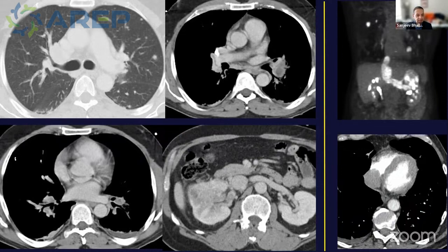Do you see mosaic attenuation? Atypical for acute PE. Do you see cavitary infarcts? Again, that makes us think of septic emboli. Look at the right heart. Is there right ventricular enlargement? That might be suggestive that it's going to be massive or submassive PE. Is it hypertrophied? That suggests it's something that's longer.